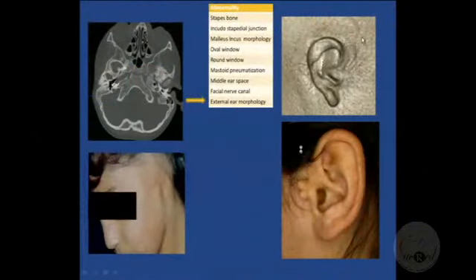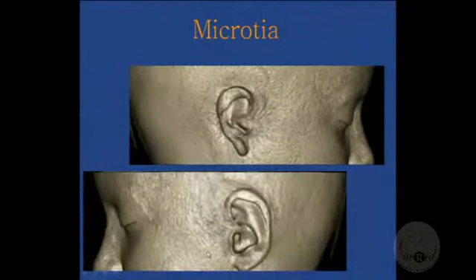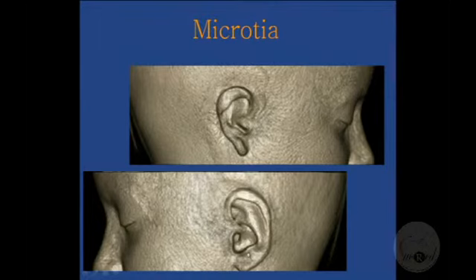So I want you to reconstruct, and this is my protocol. I always tell them, not a standard protocol, I always call the tech, I want the skin rendering. And they give me these two pictures, one from the right projection, one from the left projection. So I can really compare both the pinna. So always ask for skin rendering.